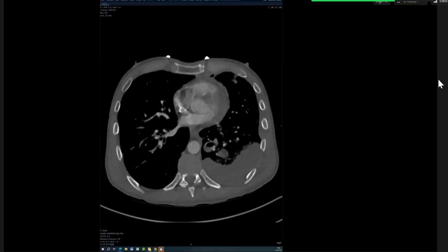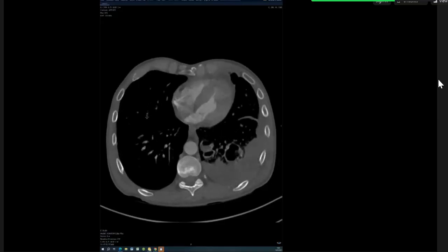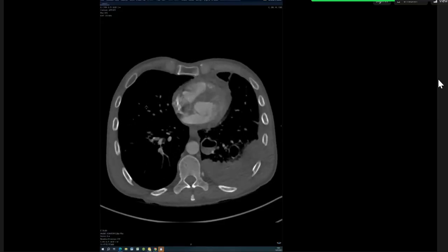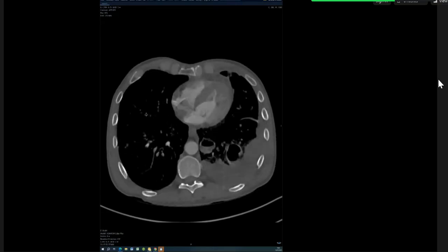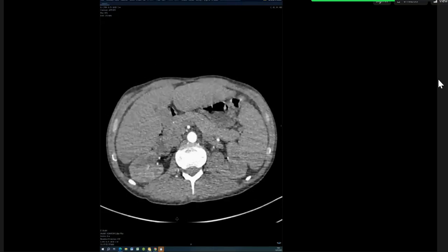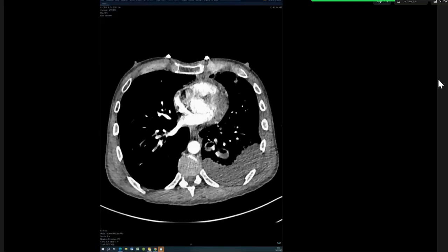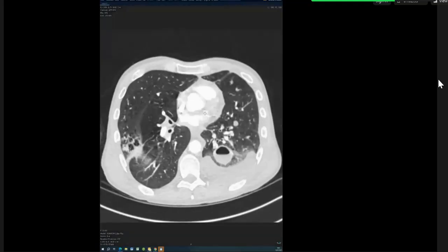To be honest, I am not accustomed to evaluating endocarditis on CT. But I can see that there are irregularities in the wall and the septum of the heart. So what's the test of choice to look for endocarditis? I think echo to see the vegetations.